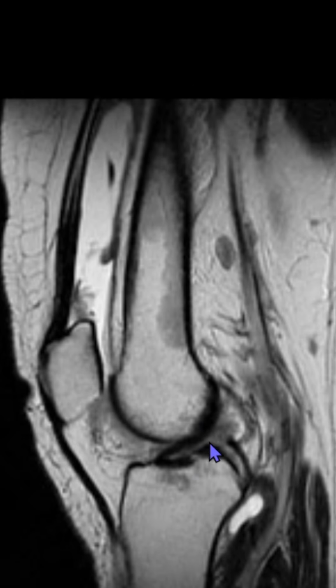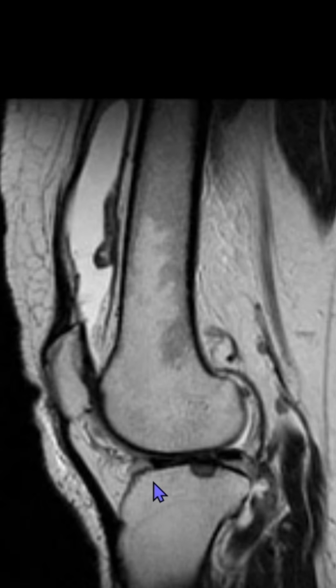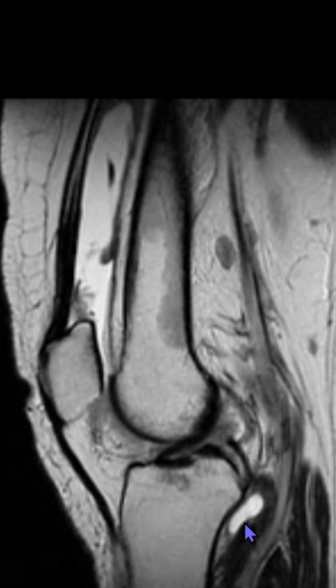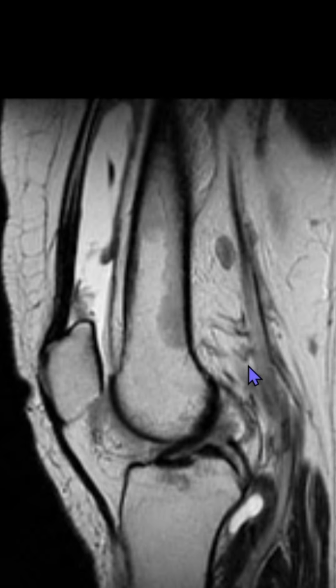the ACL we have got this frond-like thickening of the synovium, and in the prefemoral fat pad and in the Hoffa's fat pad as well we have got significant synovial thickening which is evident, and we see that fluid is going within the popliteal recess, and this recess itself shows thickened synovium with it. So this is the case when we should suspect a primary synovitis.